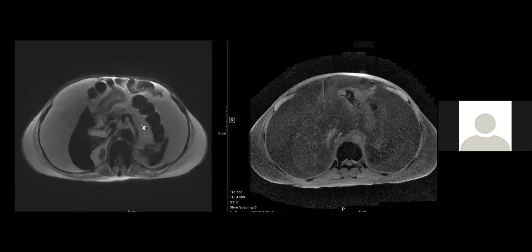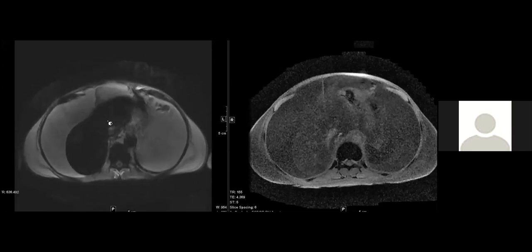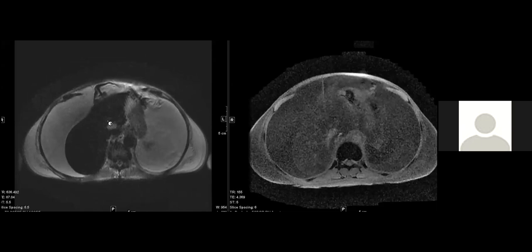So this is something very uncommon when you absolutely have no fat planes. But this is something to remember again, that the Indian ink artifact requires fat water interfaces. So in this case, there's no fat. As far as MR is concerned, this patient is one big water bag.